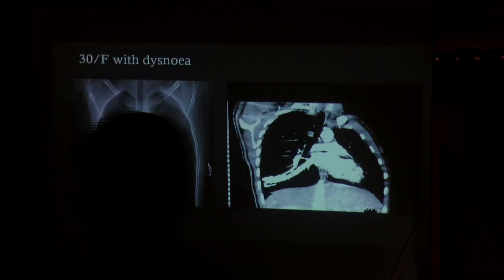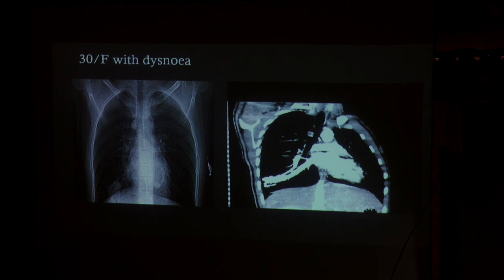So here is another case, a 30-year-old female with dyspnea. It is also a spotter. Anybody? Diagnosis? So in this chest X-ray, you can see a well-defined opacity in the right lower zone, and also you can see another opacity in the lingular lesion or the retrocardiac region, and superior to it, you can see a linear vascular structure supplying it. Differentials or diagnosis? Anybody?